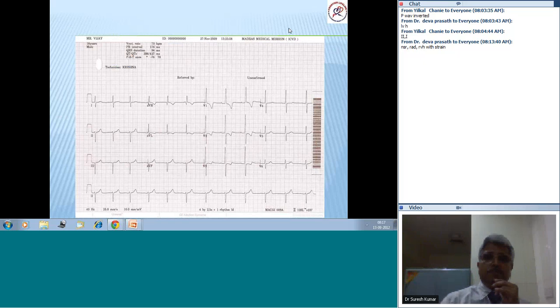Simple enough, so I won't give you too much time on this. RVH with strain, very good. That's all that it shows.